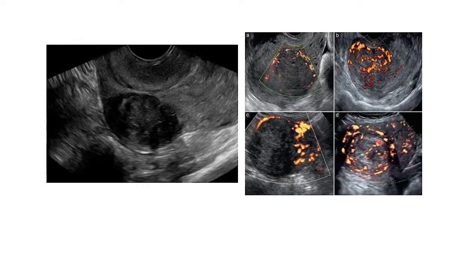So when you're doing an ultrasound scan, then you see a fibroid that has got internal vascularity or blood supply, you must query cancerous transformation. Do not just ignore that and comment it as a normal fibroid, because the gynecologist can just try to take it out when it's a cancer. So, the management of cancer is very different from these benign lesions.